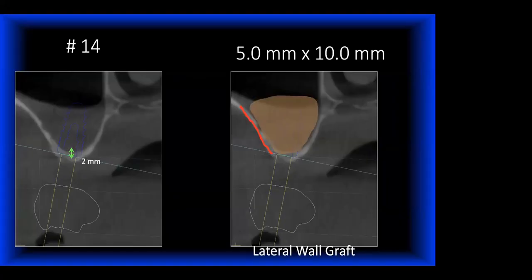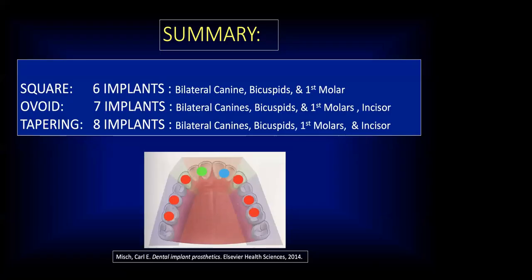With this particular case, because of this pathology, number 1, I would get a new, higher CBCT, determine if the maxillary ostium is patent, and this patient would definitely go to an ENT. Most likely, if the ostium's patent, the ENT would clear this patient after a course of antibiotics, and also prior to your graft, you're going to give prophylactic antibiotics, which would decrease the inflammation and any infection in that area. But definitely with the rhinosinusitis there, that patient should see an ENT after you determine if the ostium's patent.